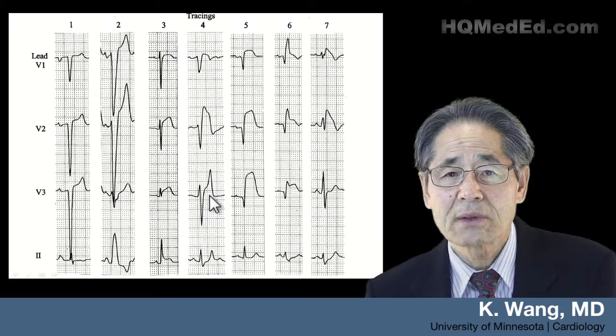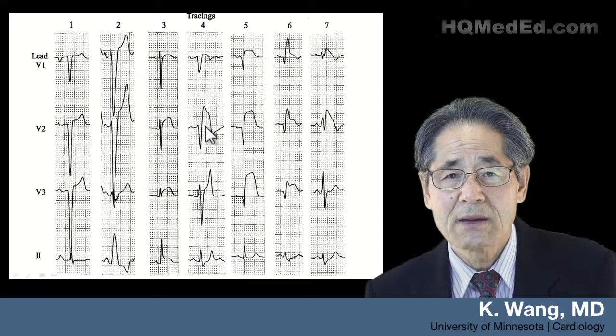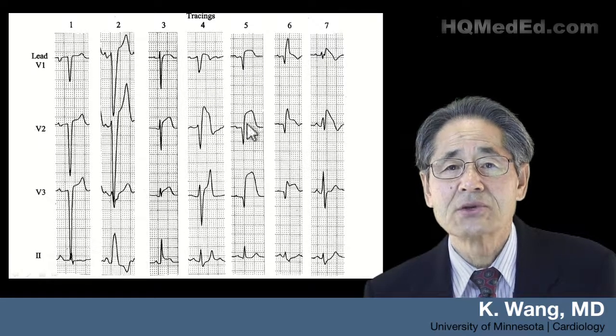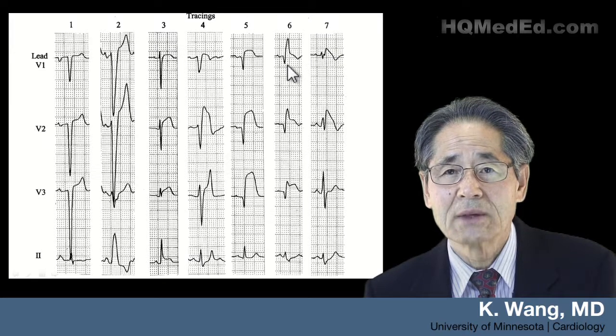This is hyperkalemia causing an acquired Brugada ECG pattern or pseudo-infarction pattern. Finally, this is STEMI. How about this one?